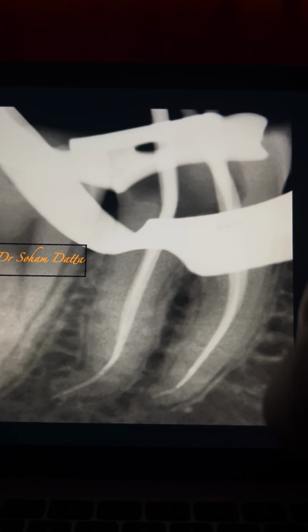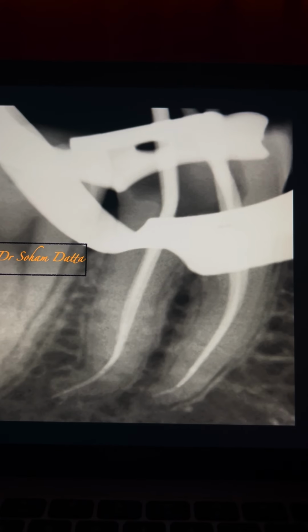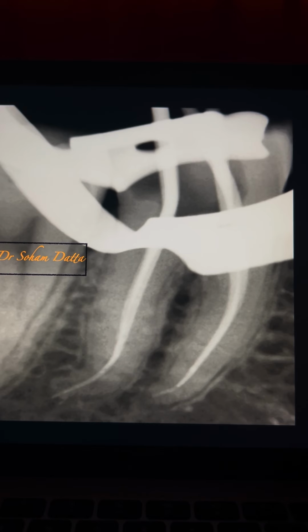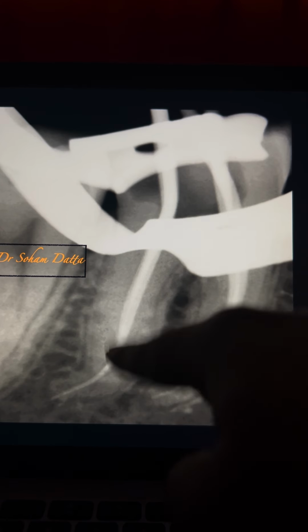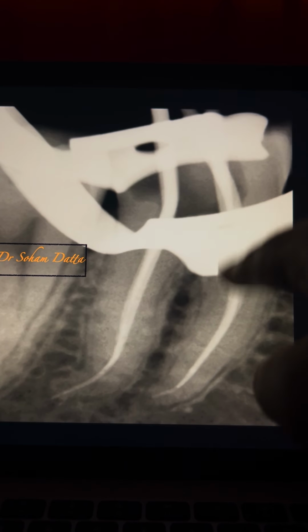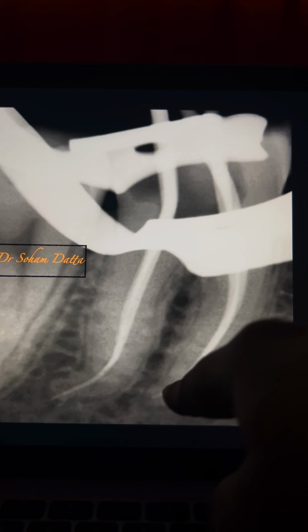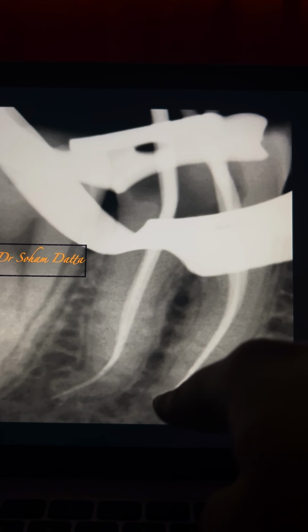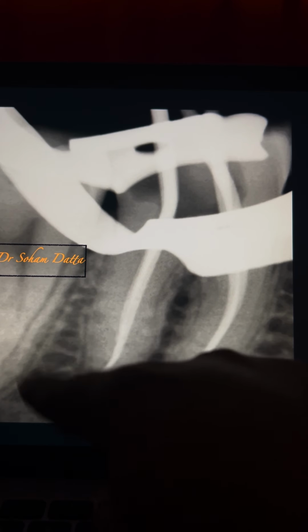Both the canal configurations, that is on the distal side and also on the mesial side, are 2-1. That means Vertucci type 2 in both the roots. Mesial root, Vertucci type 2, distal root, Vertucci type 2. Two canals at the orifice and up to the middle third of the canal, and it becomes a single canal. Two canals join each other at the apical part in the mesial root as well as in the distal root.